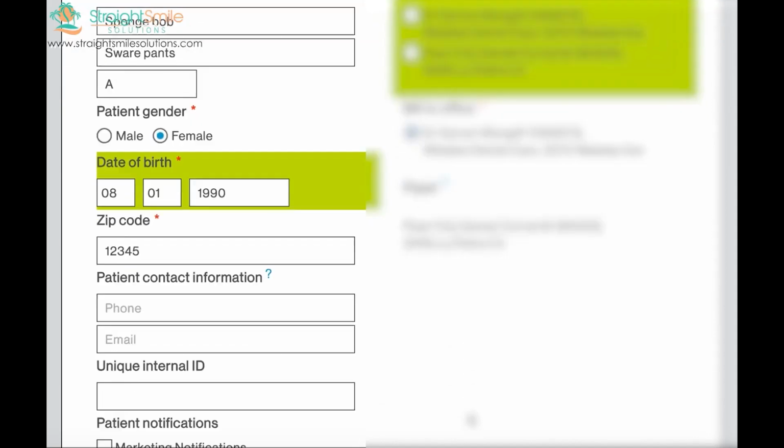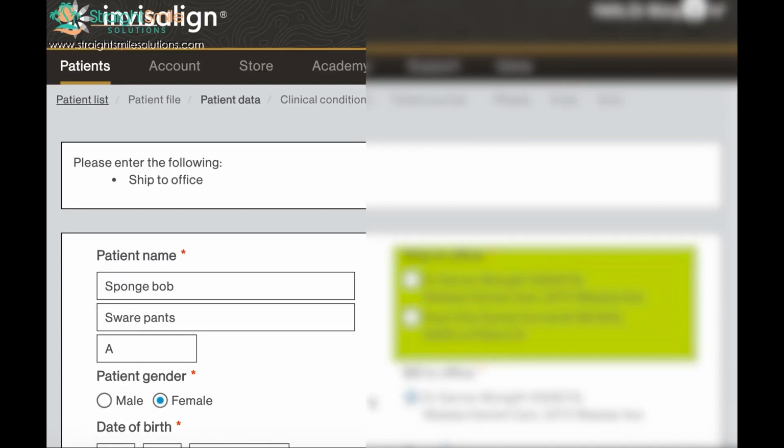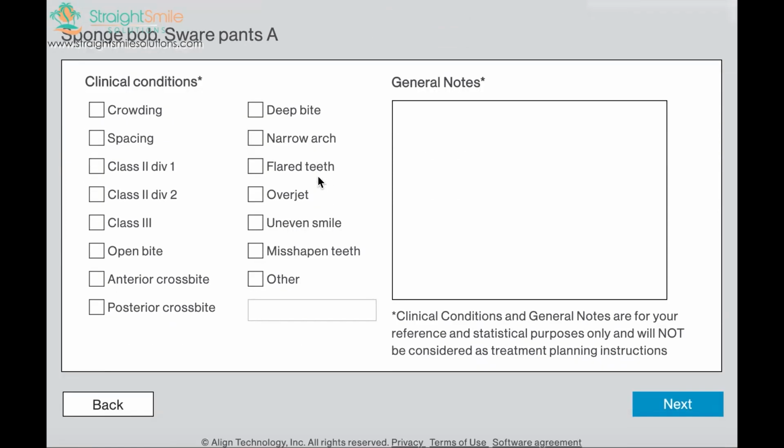All right. You have to say where you want it shipped. Oh, come on. Okay. So you don't have to fill this stuff out. I mean, to be honest, I don't even bother unless there's something special that they don't know about. They should know all this stuff, but they say you have to. So mostly you can just say hi. They're not going to read it anyways.